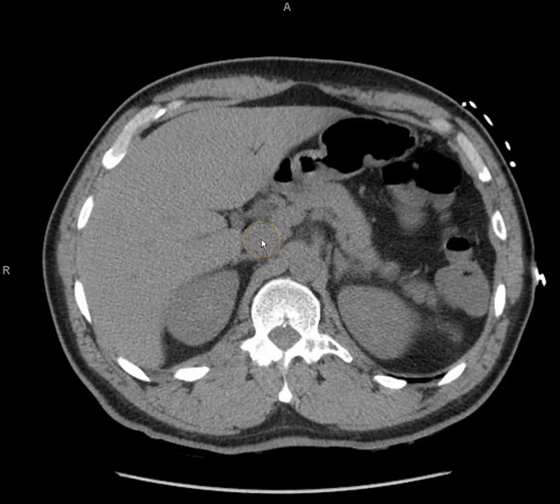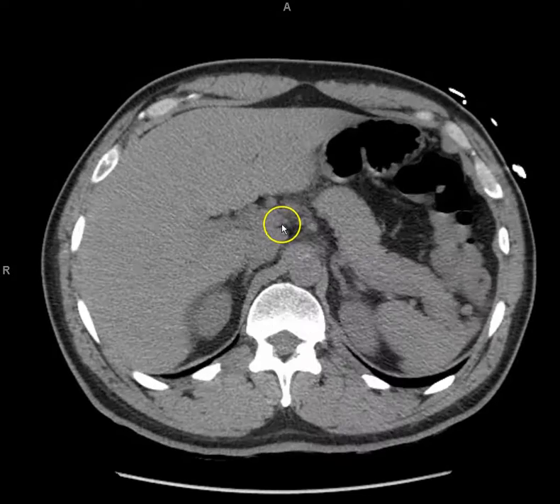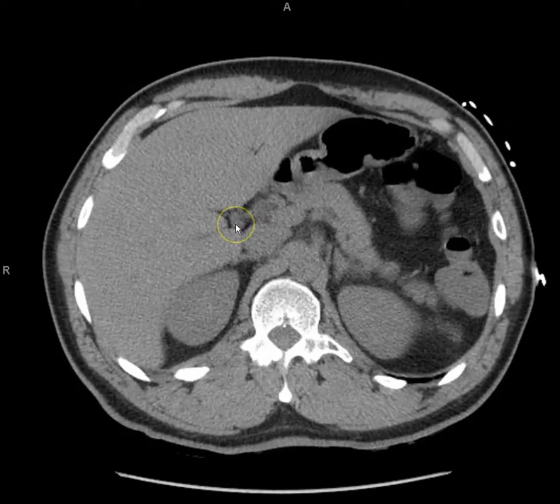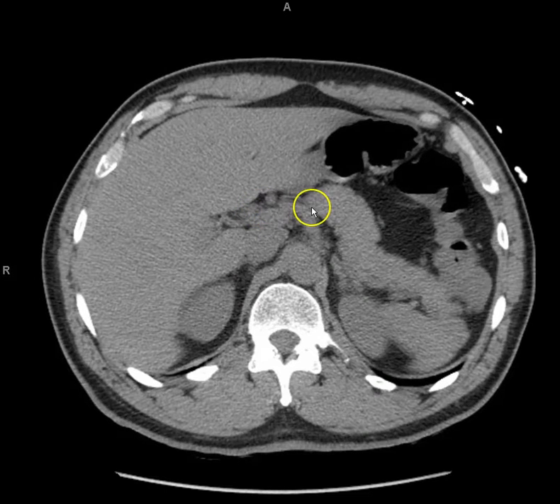So, you know what the hepatic vein is? The hepatic veins go from the liver to the IVC. They drain the liver. Whereas the portal veins are actually inflow into the liver. You can't see it very well here, but off of this aortic branch, you'll get a hepatic artery, which runs alongside here. And I can't really make it out because there's no contrast. It's all fuzzy. What is this organ here?